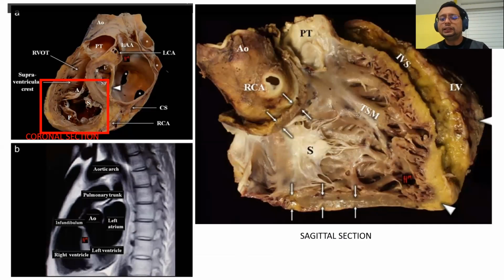Now, this is the surface of the right ventricle, and you can see that the trabeculae are coarser. In this patient, we can't really see a big moderator band. That is a moderator band there, but it is not quite big. That is a septomarginal band there. That is the septal leaflet of the tricuspid valve. So the blood will flow like so.